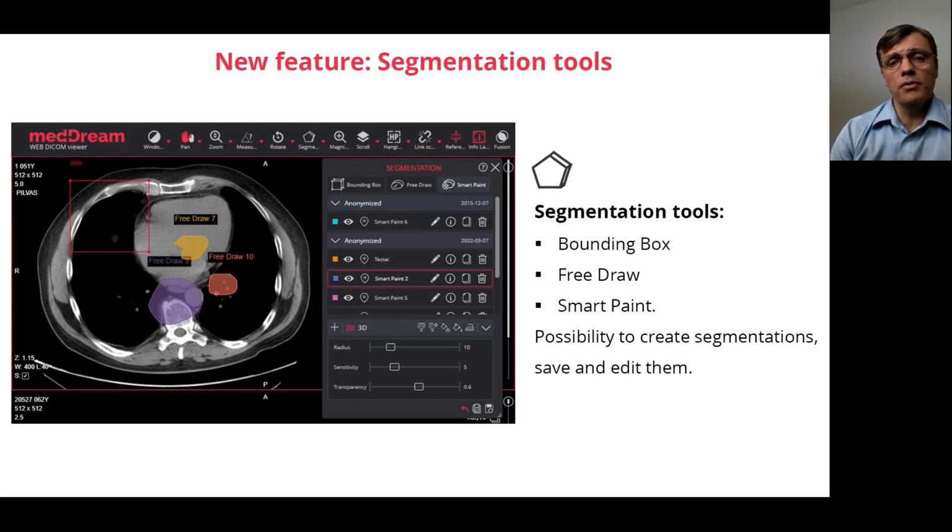Another very important hint which you need to know: it's very friendly with tablets and with pens. So doctors who use pens can segment very fast with our tools, and we even had symposiums where our partner Collective Mind Radiology did big segmentation trainings. The doctors were able to segment something like a kidney with cancer in 30 minutes with very precise results. So this is also one of the fastest ways of segmenting data now.